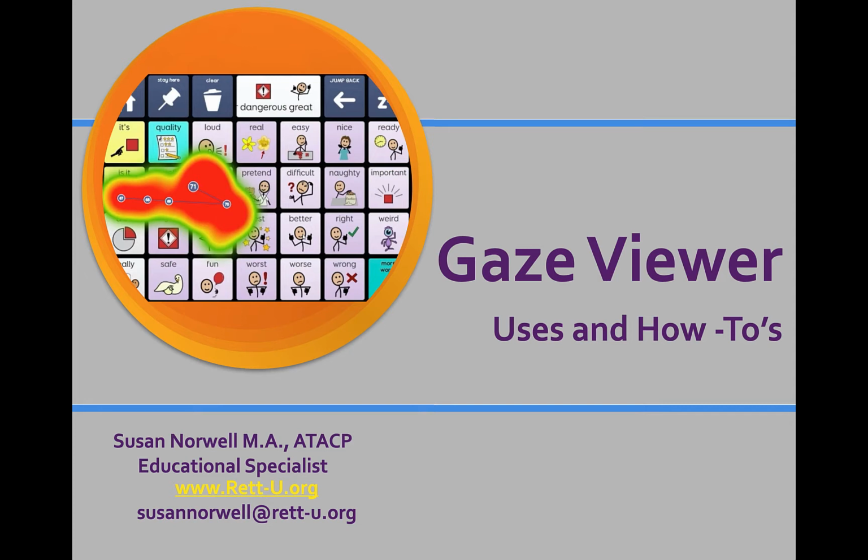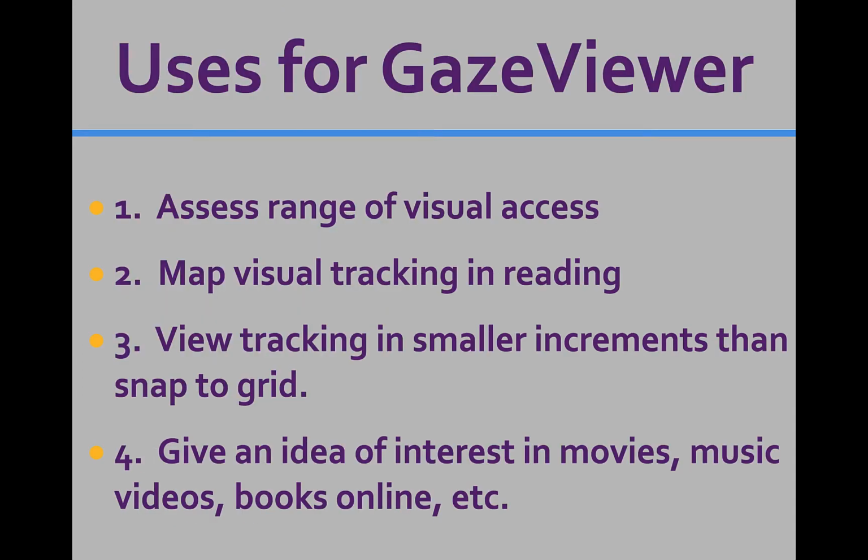I listened to a post on Facebook from a mom who was wondering if her daughter was seeing the entire width and breadth of the device and felt that she was only focusing on the middle. And Jen Facinelli suggested using Gaze Viewer, and I thought, hey, this would be a great course to do because using Gaze Viewer to some people is like, what? Didn't even know it was there, don't know what it is, and don't know how to do it. So that's what we're going to learn today.